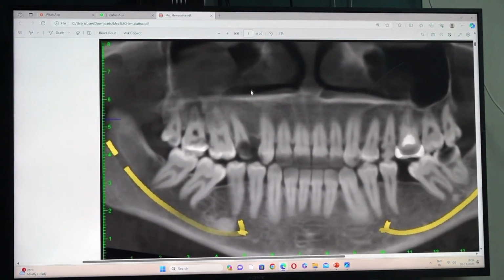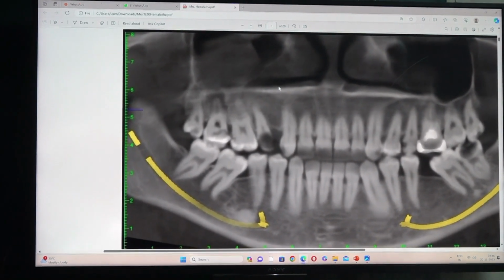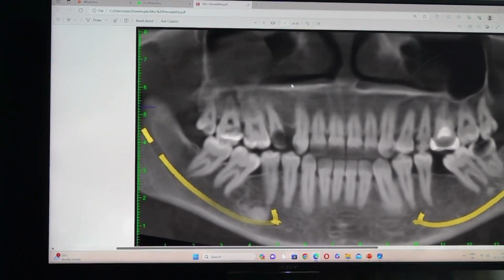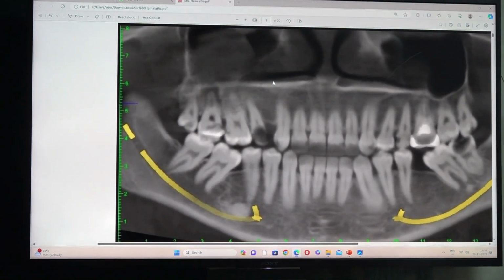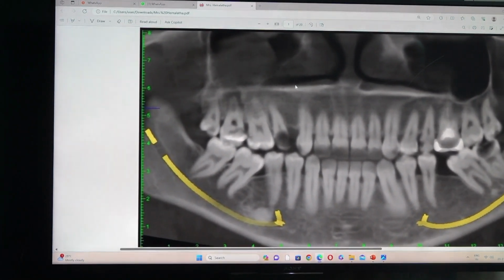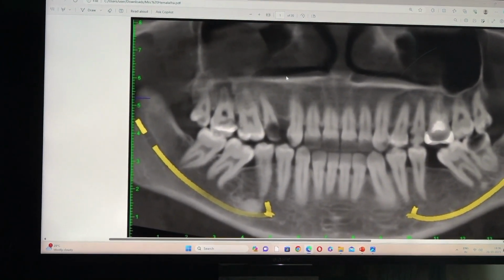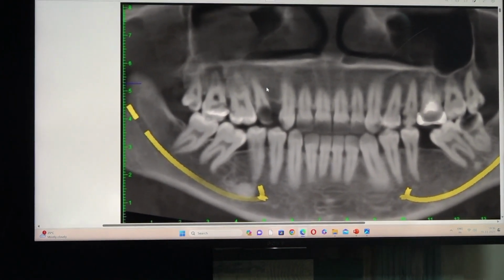So at 1-4 we can place either an axial implant or a mesially tilted one. If you are tilting mesially, you have to tilt palatally also, because palatal to the canine there is a lot of good bone. So at 1-4, place the implant either straight axial or slightly mesial. But whatever it is, axial or mesial, you have to go along the palatal wall. That's it. Since it is a healed area, you can choose a compressive implant.